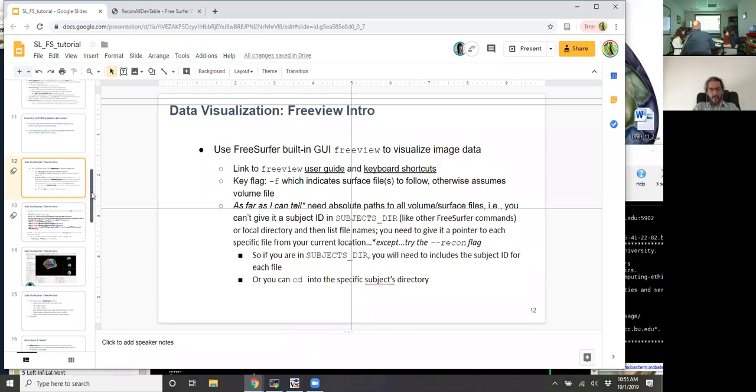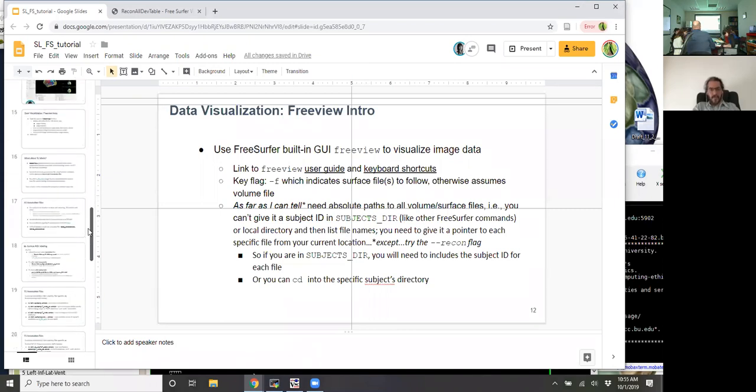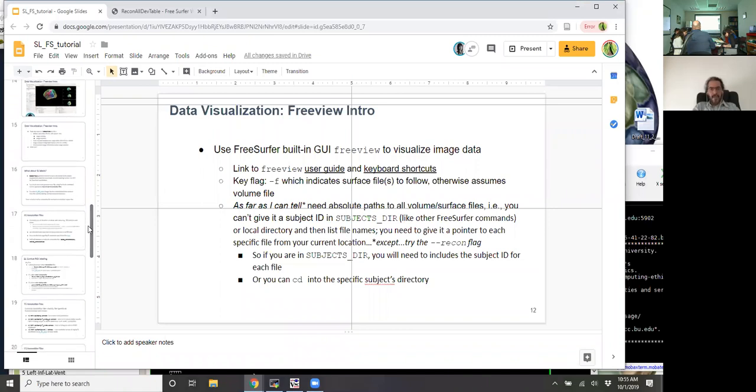Otherwise, it's up to the user to point. And the way we're trying to make it, any additions we make to the color table, be it the surface color table or the volume color table, you're not changing anything. You're just making additions. Right.